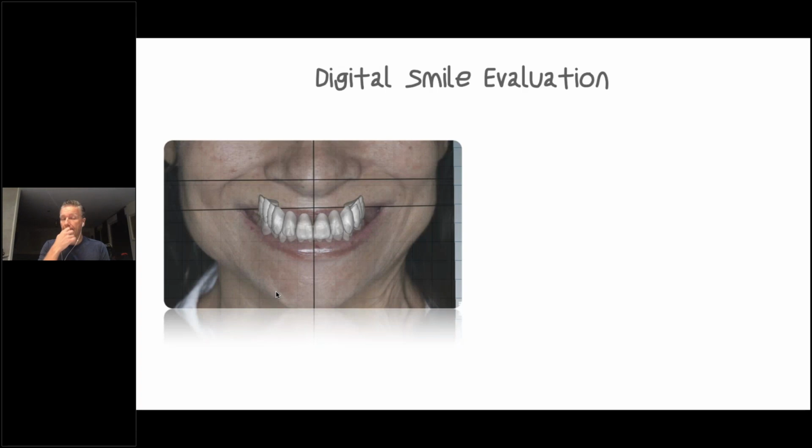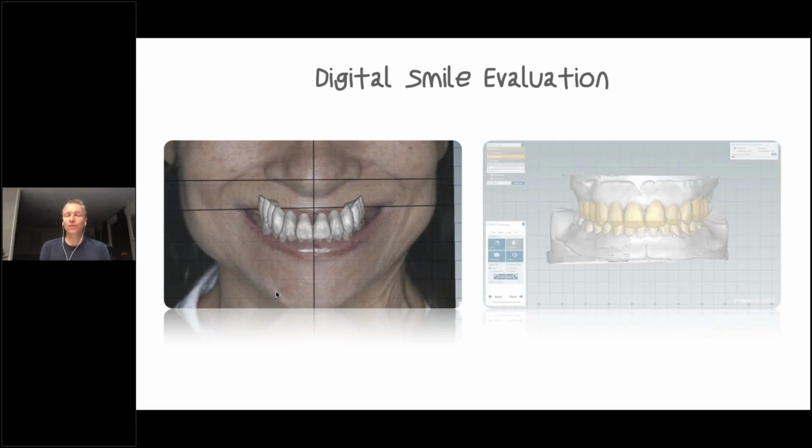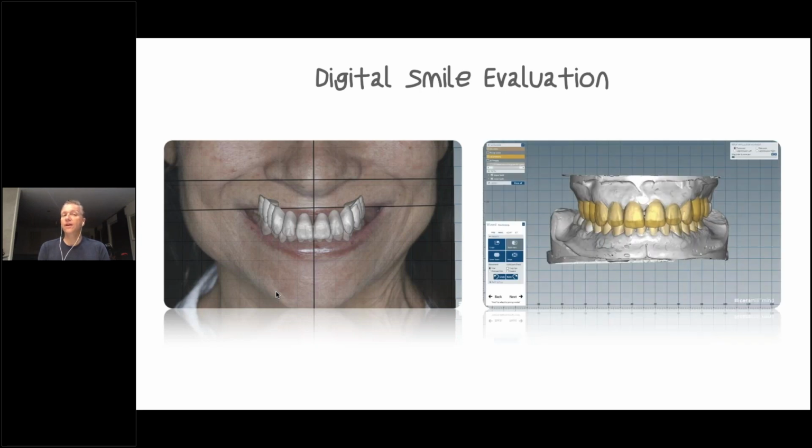We start doing a digital smile evaluation. That was actually before the M-Smile, so I utilized the software already there, putting photos in to get landmarks and get an idea where we are. Then I can start putting teeth in place with a bite opening, so we could open the virtual articulator to the proper opening. We opened 5 millimeters to be able to raise the lower anteriors and also put some tabletop veneers or tabletop onlays on the posteriors in the lower, in the mandible.